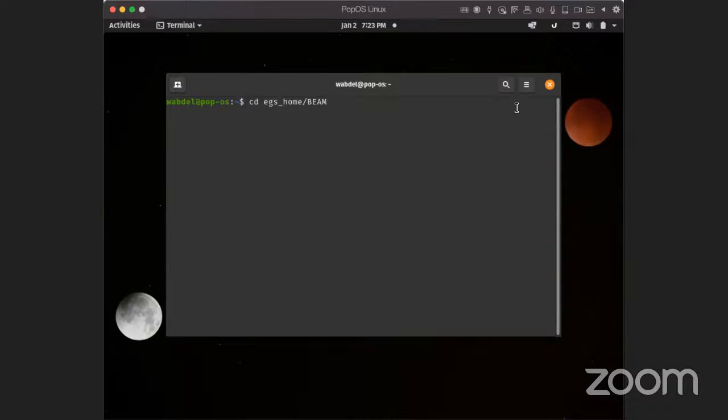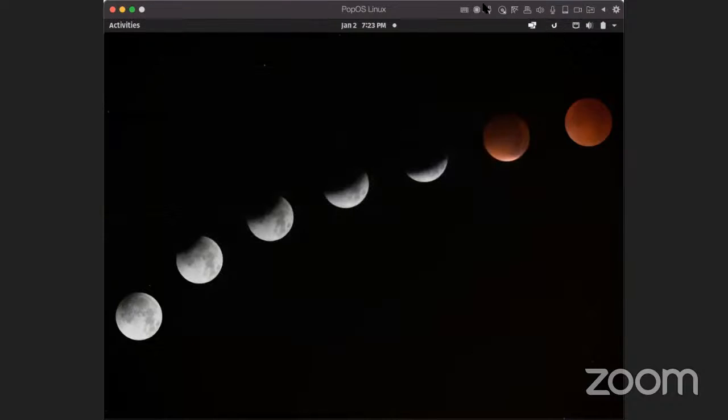Okay, I don't have the precise Linux here. I will look into these MLCs and probably reply back to you on our group. Yes, sir. But the opening looks fine. The opening looks okay to me, to tell you the truth. When I look at the top view, it seems it's open.